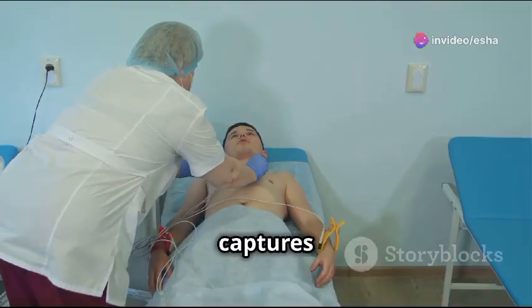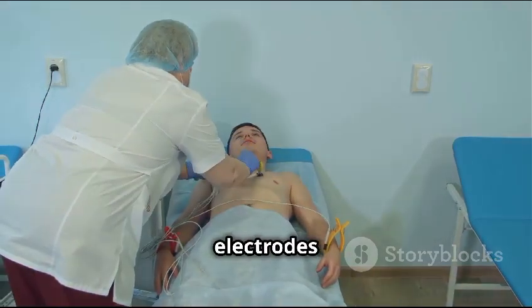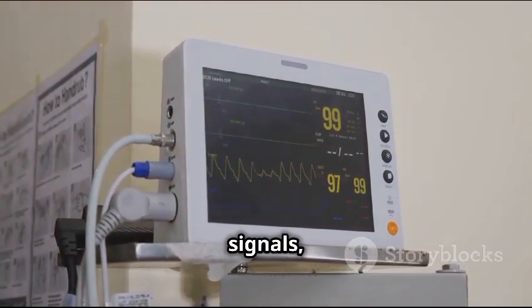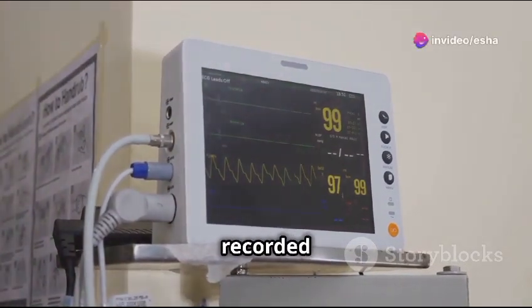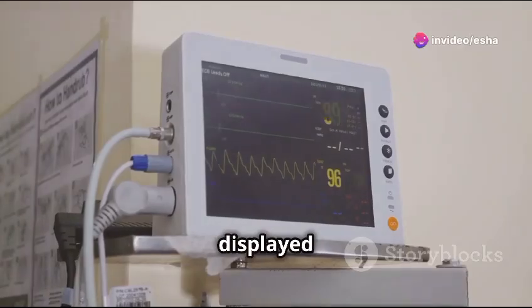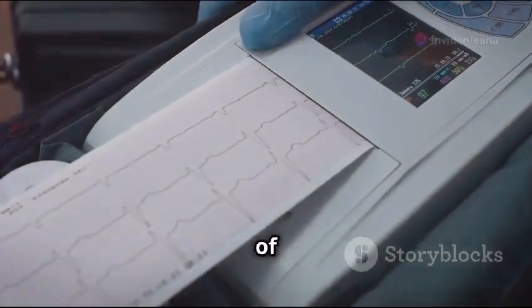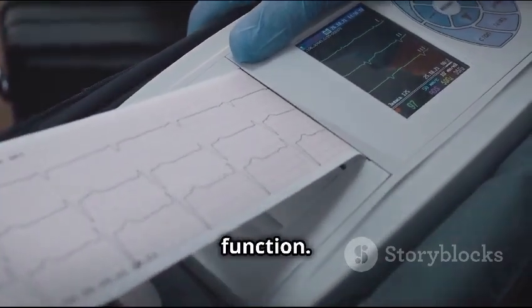The ECG captures this electrical activity through electrodes placed on the skin. These electrodes detect the electrical signals, which are then amplified and recorded on a moving strip of paper or displayed on a monitor. The resulting ECG tracing provides a wealth of information about the heart's function.